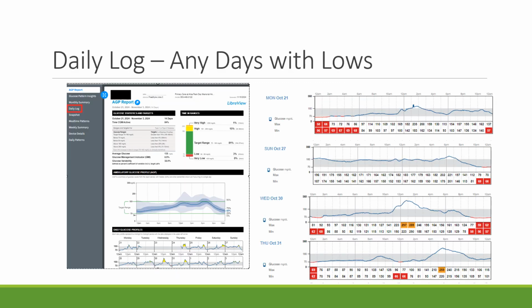The new thing that we're doing when we are putting in this data is that we are also going to be reporting the daily lows. We did this in a different way before, but it wasn't very obvious that the patient was having lows with the different reporting. So now we're asking flow staff and nurses and anybody putting this data into a chart to also go here into the daily log.